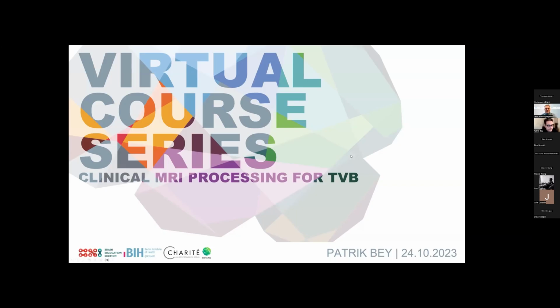As Leon said, today the focus is going to be on creating TVB digital twins, and actually the processing part of that allows us to get there to run our simulations. And the focus is going to be particularly on clinical MRI processing, so on a specific use case of ours where we have stroke data.